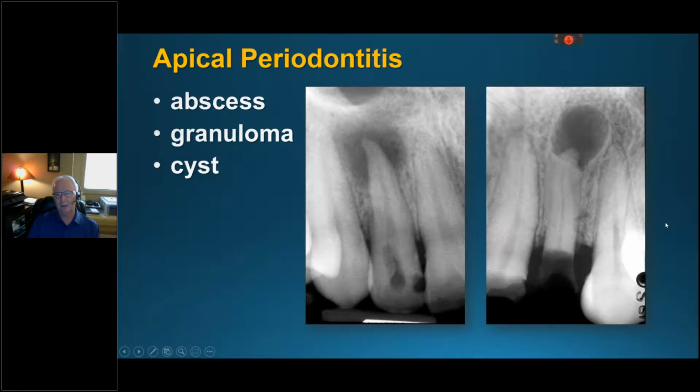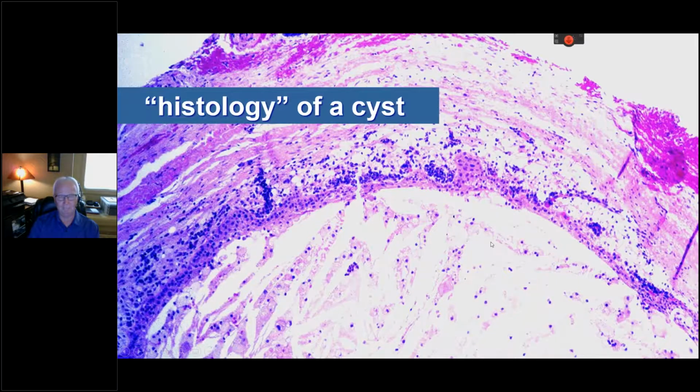So if I see a margin like this in this day and age, it's going to be, I can try the root canal, Mrs. Jones, but it's probably not going to resolve. You have very little tooth structure here. You can spend a lot of money on a root canal, a post and core and crown, and get whatever years we get out of it, or we can take that tooth out and do an implant. So the treatment is explained to the patient. It's their decision to make, but you can give them lots of good options these days.